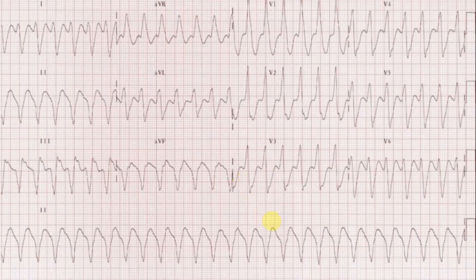Therefore, I am unable to comment on the atrioventricular dissociation. The QRS complexes are very wide, about 200 milliseconds. The QRS complexes are regular. I am struggling with the ST segments and T waves. I am unable to comment on the QTC either. The aVR lead has large R waves suggestive of a northwest axis.